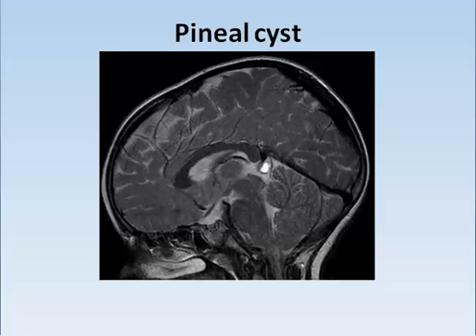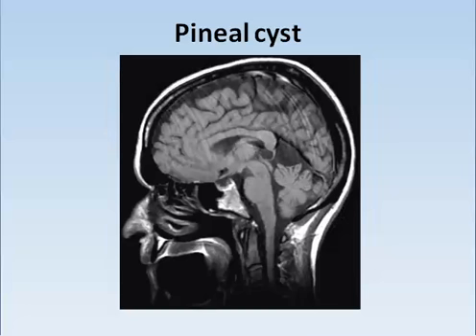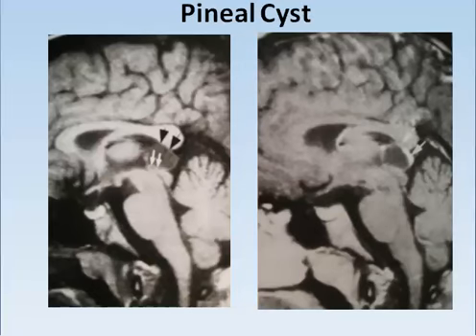Here it is seen as a cyst of more than 1 centimeter. Here is another cyst in T1 weighted images, and here is a third cyst compressing the quadrigeminal plate, with some enhancement of the margin.